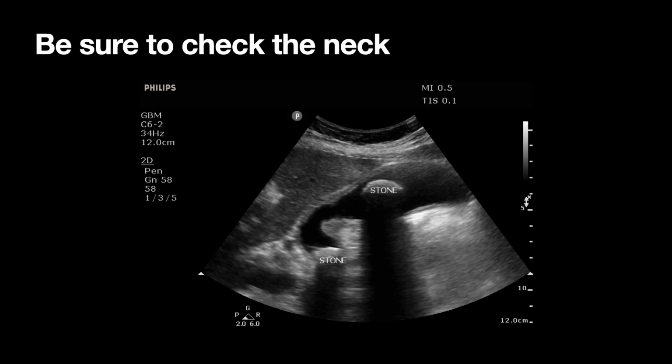Again, just to reiterate and pound this home, always be sure to check that neck, right? So this is a study that we did, an easy one to pick up in the gallbladder lumen, right? Not quite in the fundus yet, but in the body of the gallbladder.